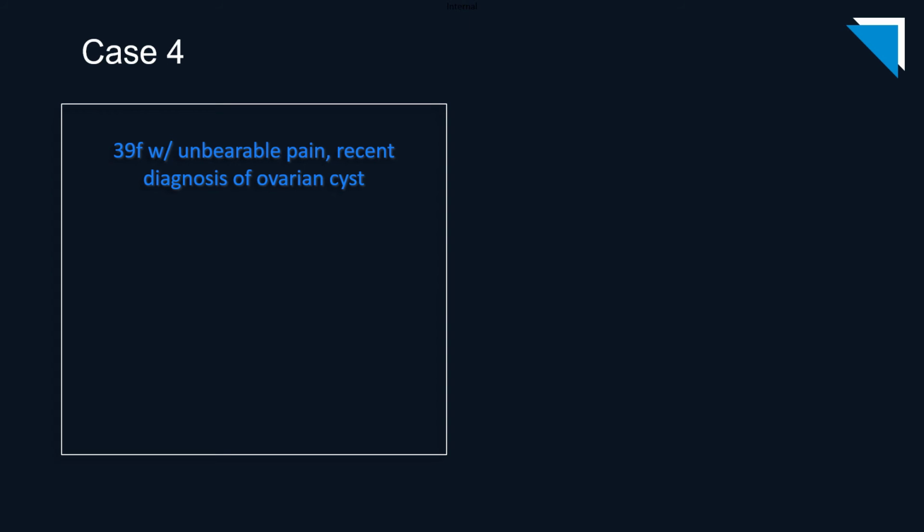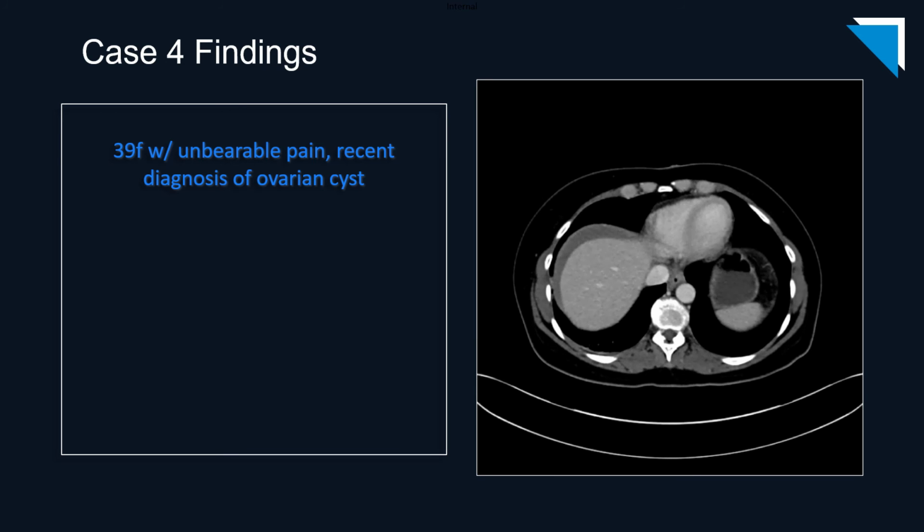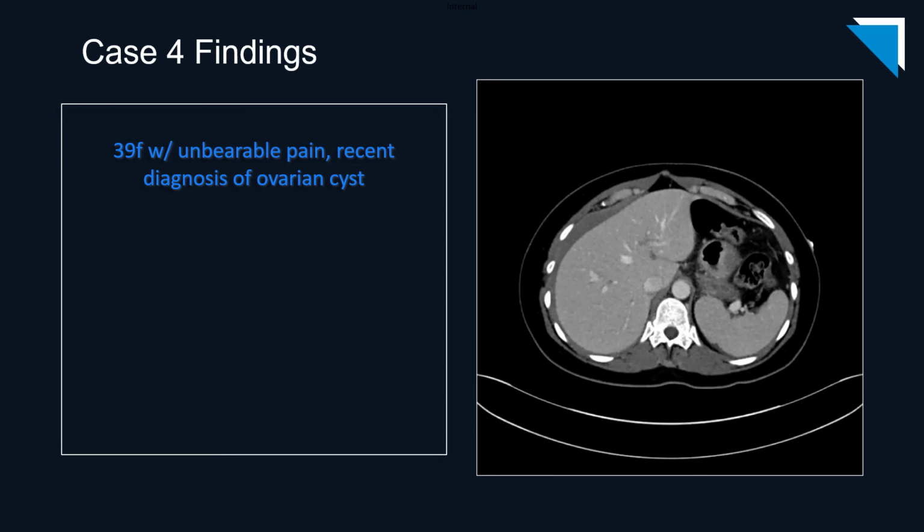Our last patient today is a 39-year-old woman with unbearable pain and a recent diagnosis of an ovarian cyst. Here first are the axial images from a contrast-enhanced CT scan of the abdomen and pelvis.